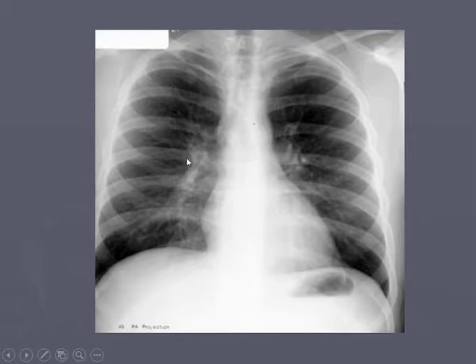And here's some more examples. See, this one is a little bit, have the left pulmonary artery here, the right here. See how they're even there? So that tells us something's not right. Something's pulling this up for some reason. Then we have our normal cardiac shadow.